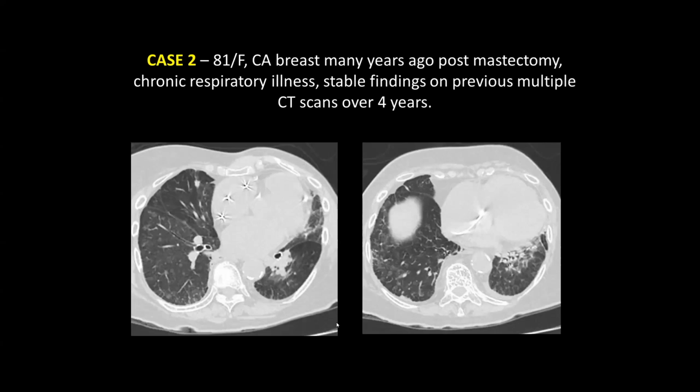So what are the main findings in the right lower lobe specifically, which I told you? There are post-RT changes, I agree, left side and all those things. But the main finding in the right lower lobe is the presence of multiple ground glass attenuation nodules, which are around 5 millimeter, not more than that. So multiple 5 millimeter pure ground glass nodules.